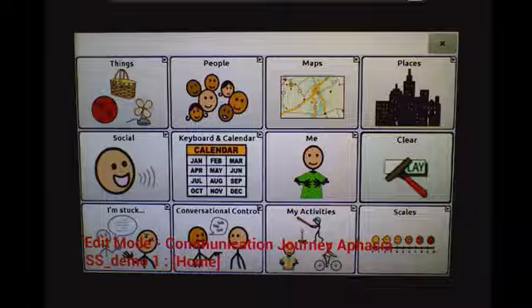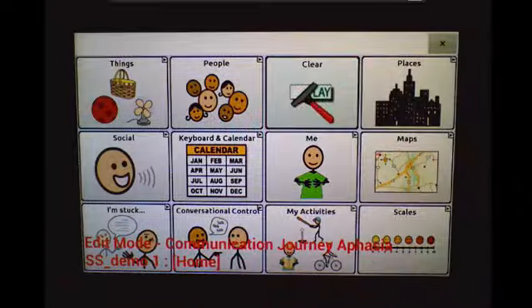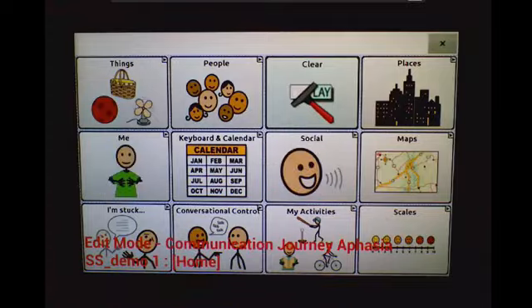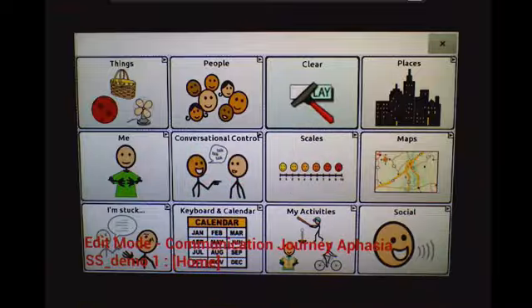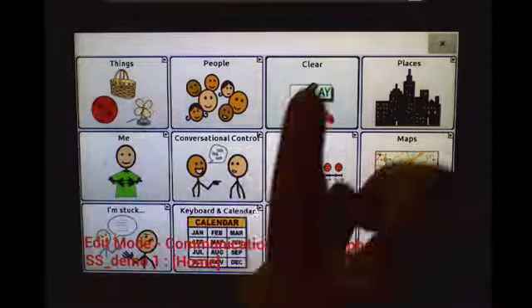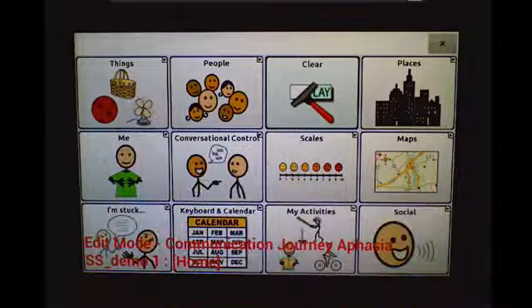We are decreasing the grid size, so we will lose buttons through the process. We need to rearrange the grid to keep the desired buttons. I will move the desired buttons to fill 2 rows and 3 columns, starting from left to right. My desired buttons are in the first 2 rows and the first 3 columns. Now I need to change the page layout to achieve the 6-location grid.